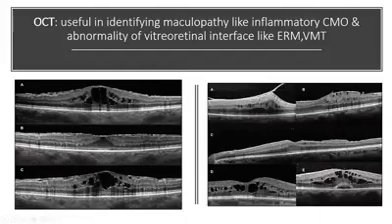We can also look for any abnormality of the vitreoretinal interface, like vitreomacular traction, and also for the presence of any vitritis. Now, one of the useful tools of the OCT in some cases is the 3D OCT.